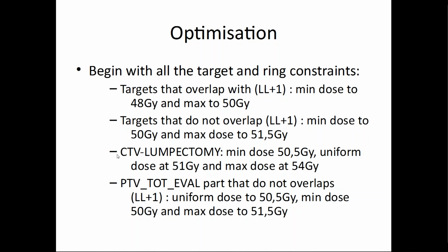And the CTV is treated separately to be sure that the global max location is inside the CTV. I segmented all the targets because the smaller the structure is, the more powerful the constraint will be. So I put a lot of structures to be sure the dose is as I want.